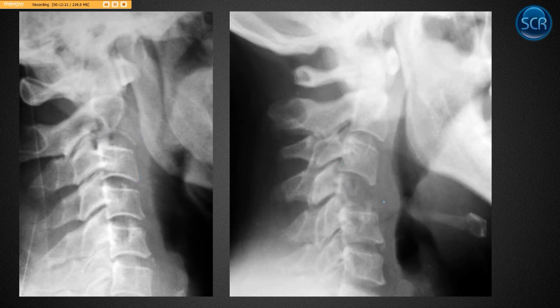This one, of course, bad arrow. Much more obvious lytic mets, completely destroyed and collapsed. Disc spaces on either side look relatively normal, so this is vertebral body centered, probably not infection, most likely a malignant neoplasm, which this was.